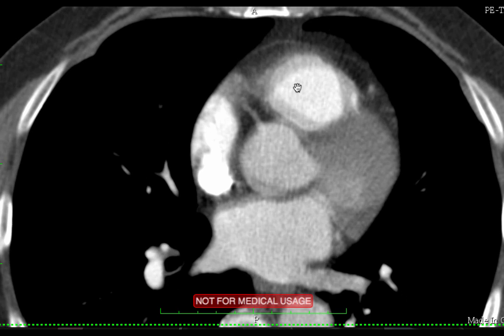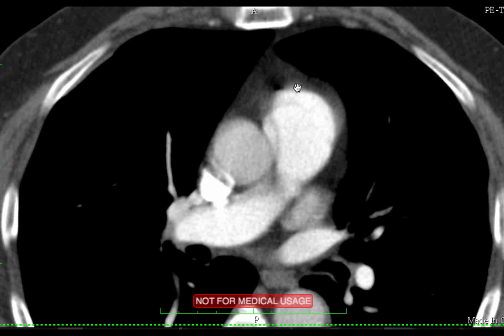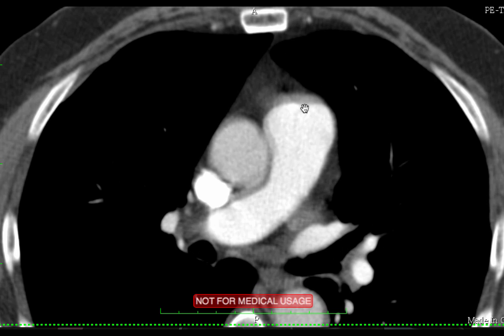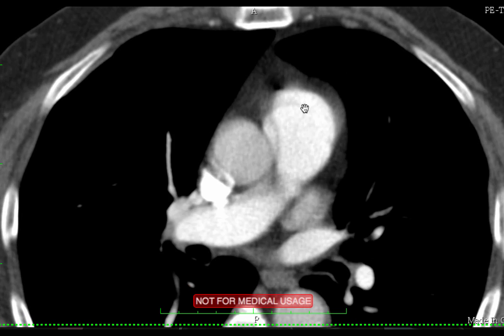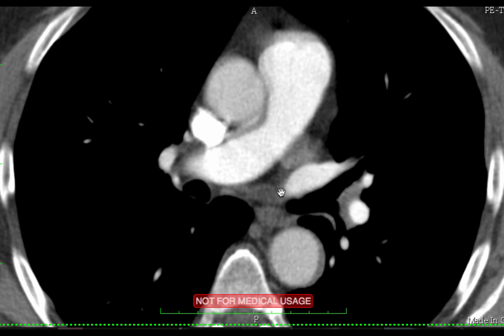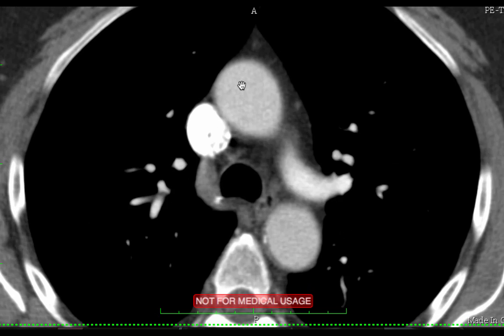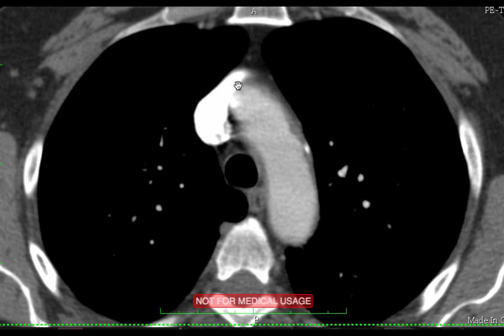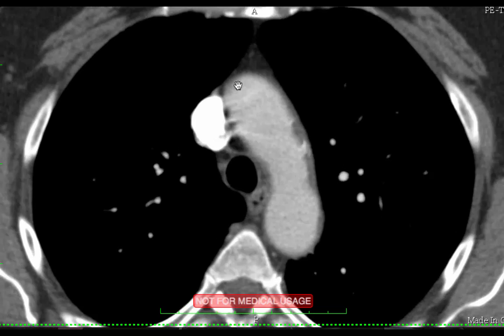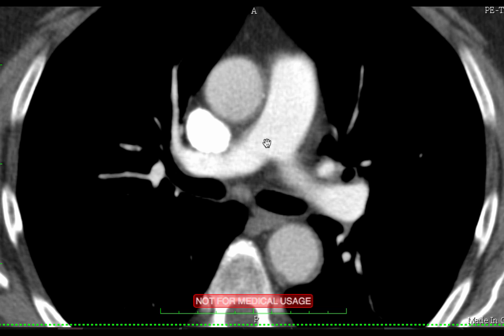and the right ventricle then sends blood to the main pulmonary outflow tract and subsequently the pulmonary artery, main pulmonary artery, into the superior mediastinum, where it crosses under the aortic arch. So here, if I go up higher, descending aorta, ascending aorta, this is the aortic arch if you go all the way up. Now if you come down, then you land on top of the main pulmonary artery and the right main pulmonary artery.